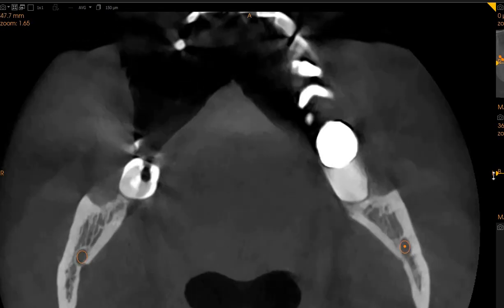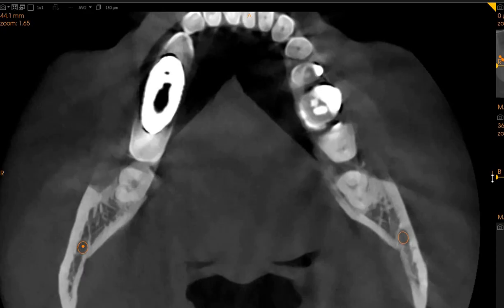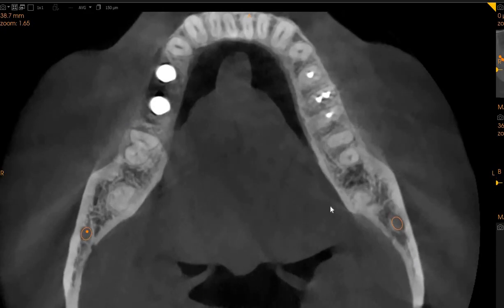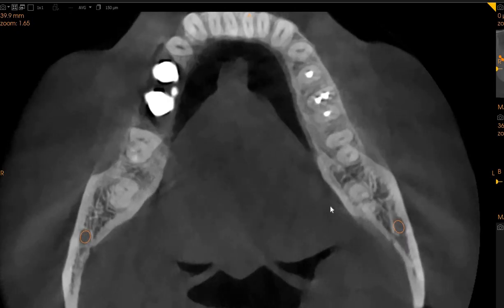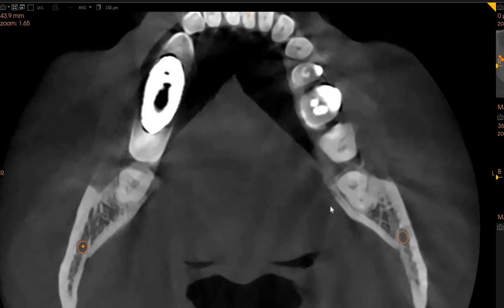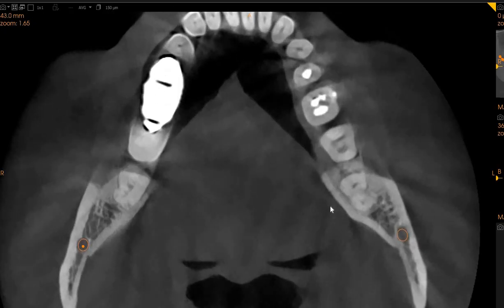So we've got the 5, 6 which are endodontically treated. The 7 has a crown. As you move further down, the problem with crown teeth is because of their very radio opaque material covering the crown. It's very hard to see cracks or fractures in the crown.